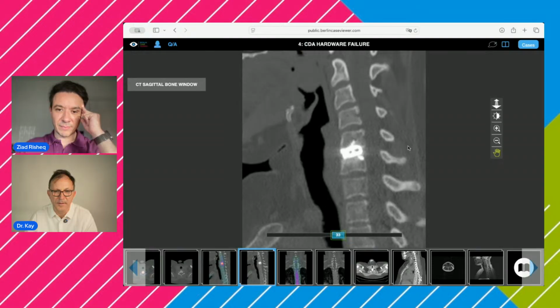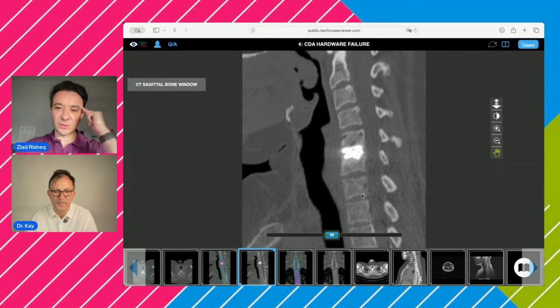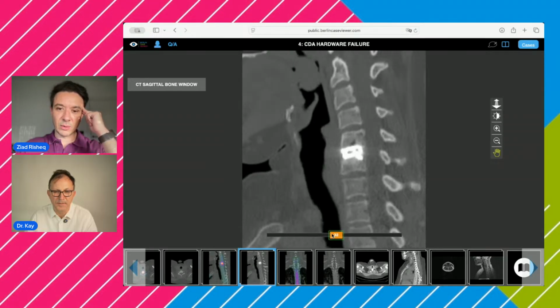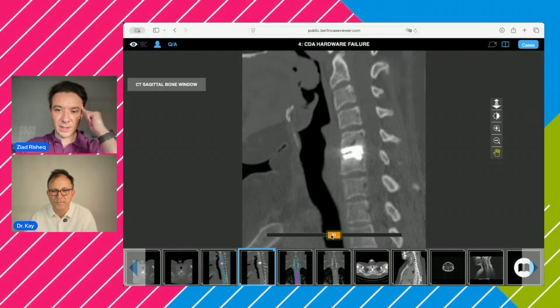In the case of prosthesis, I usually do one. You can do 1.25 of course, but I'm used to seeing much more detail with thinner slices. But there is the osteolysis that we talked about. It is definitely here, and it is showing intense uptake. So this is an inflammatory osteolysis, and this is pathological.